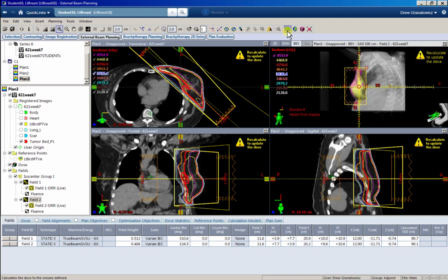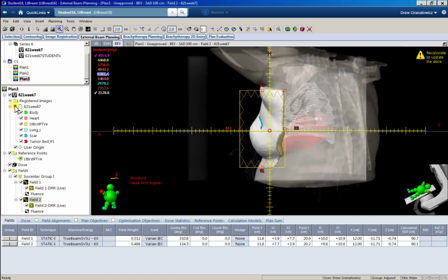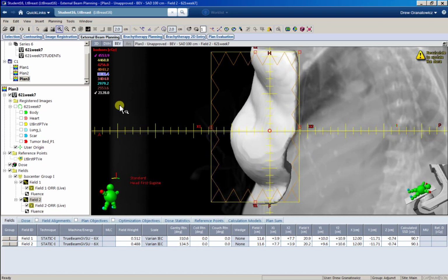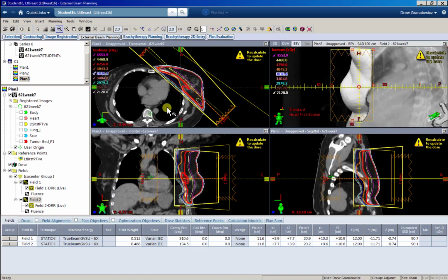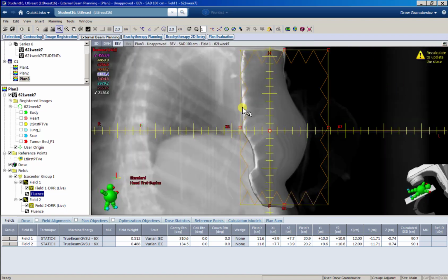Before we calculate, what we need to do is recreate our block edges. That's why it's important to create your block edge first on your field and field plan, because we have persistent dose turned on, so we can turn our 50% isodose cloud on, and that's pretty much going to be our field edge that we had set up already. Because now when we set up this irregular surface compensator, it deletes our MLCs and we just have fluences now.